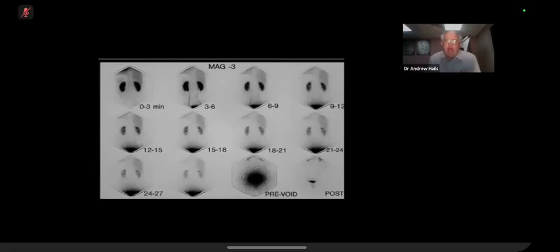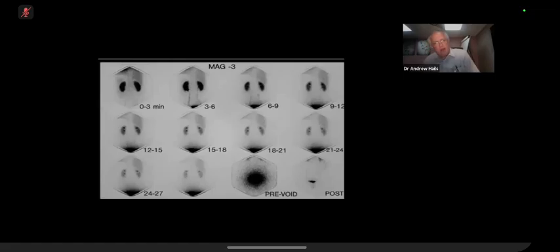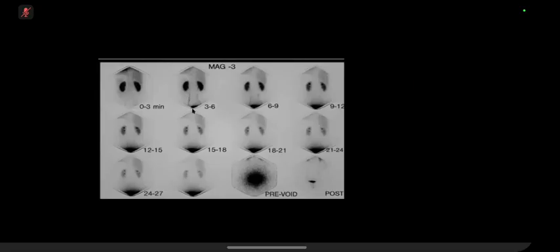Yeah. Now, admittedly, you might have left and right marked on something, but when you're doing kidneys, because they lie posteriorly, you have the gamma camera behind the person. So unlike most radiology, where the left is on the right side, in a MAG3 renogram, usually the left is actually on the left side. Okay, so yeah, that will be the left kidney, quite right.